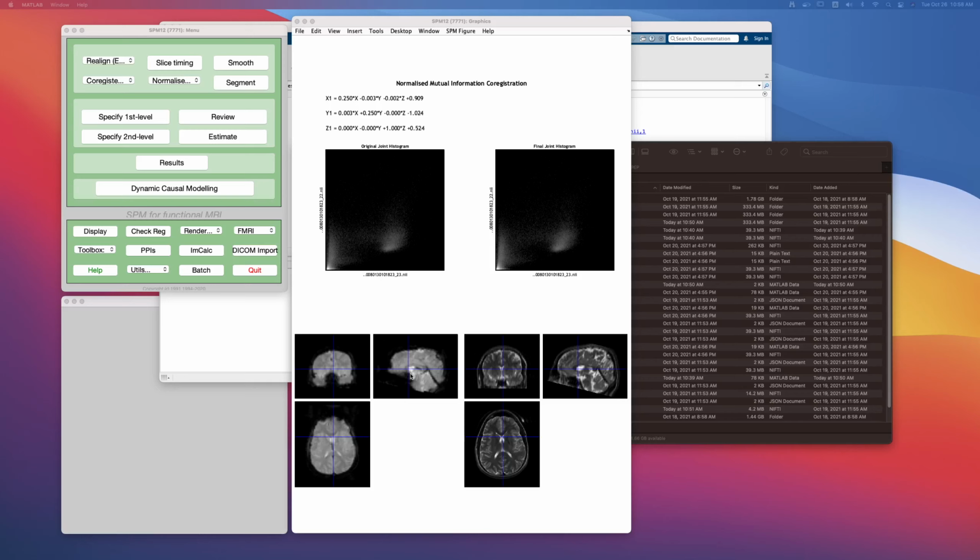So this is okay for us to just localize the structure of the EPI activity that we will see subsequently. But if we want to do things like spatial normalization, where we want to deform or normalize this person's brain to a template, a common atlas that everyone uses, so that you can match everyone's hippocampus in the same space, in the same coordinates, right? That's where we will use the T1. And remember, the T1 that we acquired was isovoxel and high resolution in all three directions.